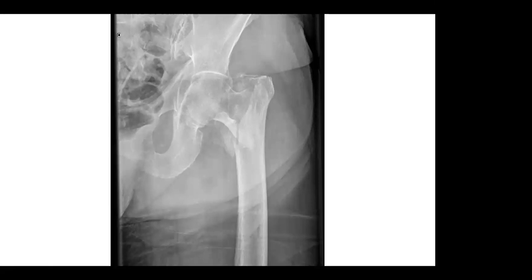People are saying NOF for this one. Yep. And if we think about the classification system I showed you guys earlier on that schematic diagram, does anybody know what kind of fracture this is? Like if we were to be more specific than neck of femur. Someone said extracapsular fracture, base cervical fracture, subcapital. Yep, so extracapsular is correct. So this is intertrochanteric. If you just trace this lucent line, you can see it's definitely going in between the greater and lesser trochanter. So this is the extracapsular intertrochanteric fracture.